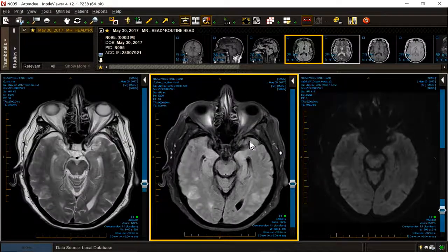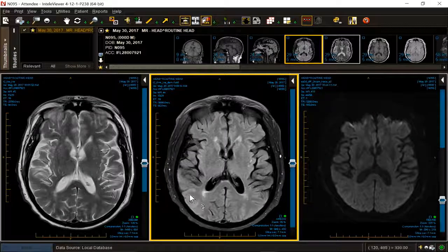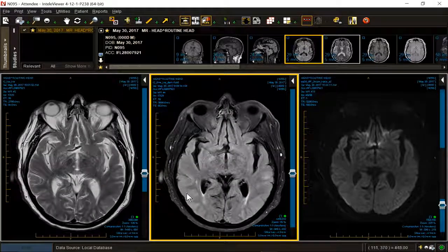Let's talk a little bit about this entity. So let's switch over for a moment. And let me highlight the abnormalities for those of you that may not be familiar with this entity. And there is mostly cortical and peripheral involvement. Now, in my experience, there's one other very important entity to include here, and that is intracranial vasculitis or leukocytoclastic vasculitis. It is more often asymmetric, but can be symmetric.